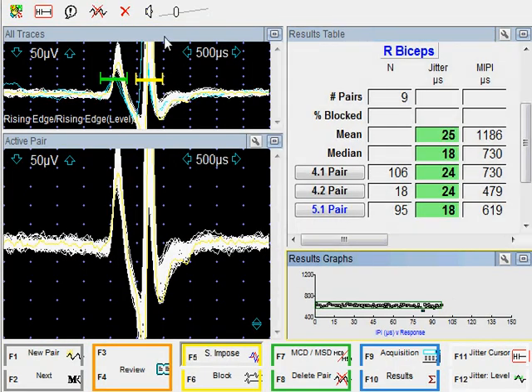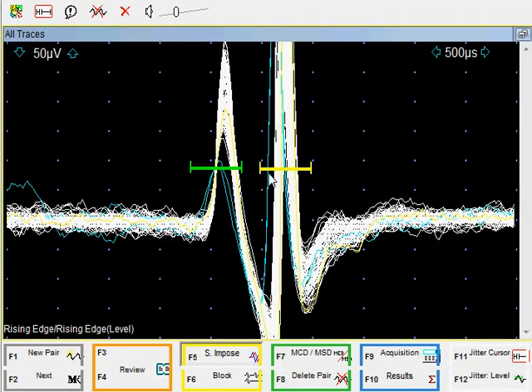Let's look at the traces over here, and here are the traces with two short interpotential intervals. You will notice that they had low amplitude, so probably our trigger point changed and it produced the short intervals. So again, I emphasize, always look at the distribution of interpotential intervals and edit the distribution by using the boxes provided in that window rather than doing trace by trace.